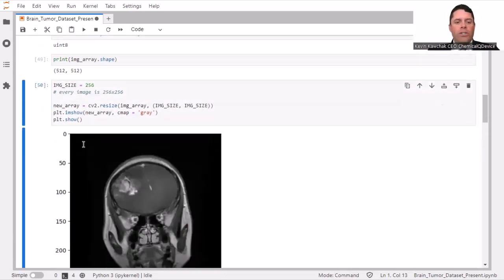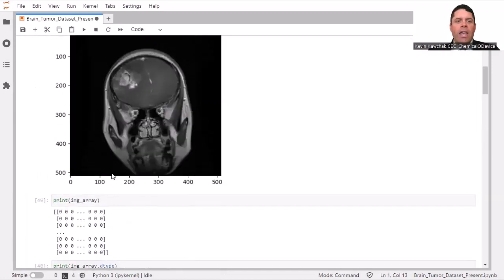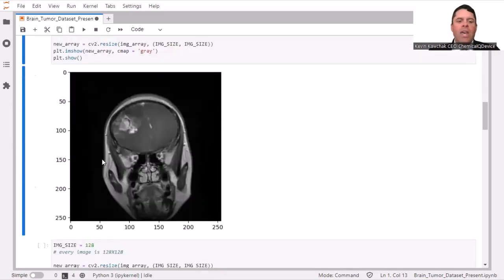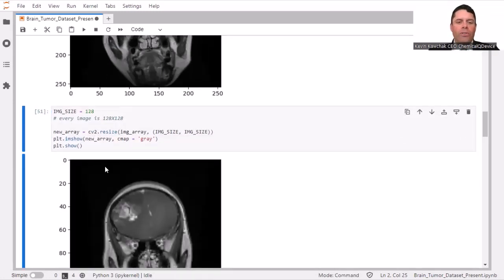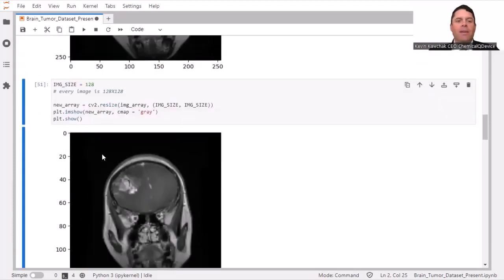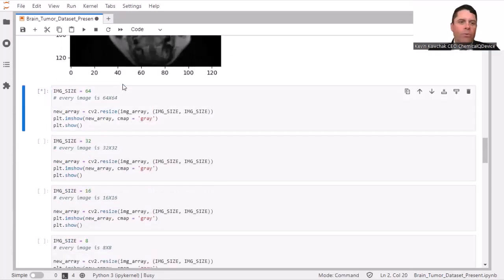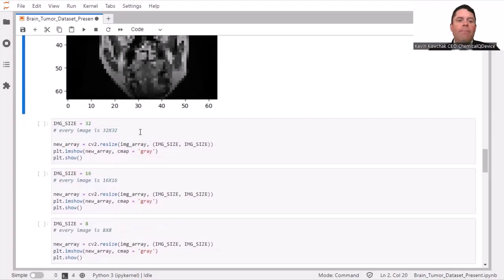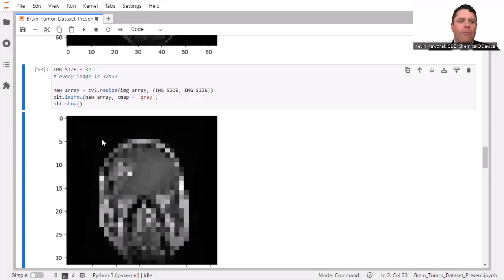And then here, this reduces down to 256. So this specific image is going to start to look less sharp. So the 256 by 256. And again, when you have AI, and basically getting fewer scans in an MRI, there are specific ways around having to have the best images with AI. So this is a 128 by 128. Here's a 64 by 64. And you can see here, it starts to get pixelated. But again, it may be workable images. It just depends on the rest of the data set, a number of different factors involved.